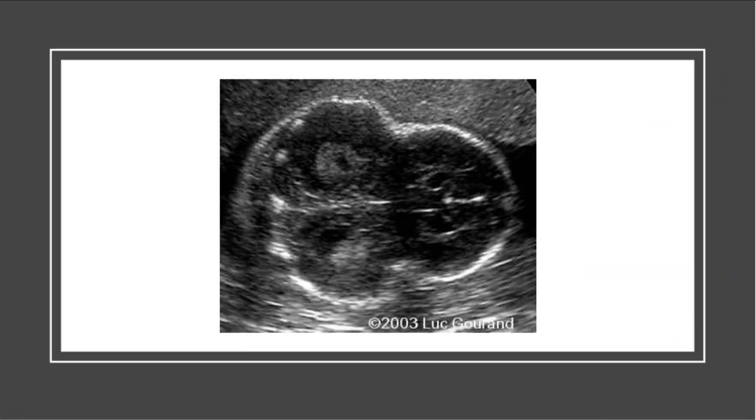So here's a classic appearance of what that cloverleaf skull is going to look like. You can see those cranial bones, especially the parietal bones on the side, forced to close and come in a lot earlier than they should have. So it's giving us this very lobular appearance. Of course, that's going to lead to some problems in terms of cognitive function, because we're now compressing the space that the brain has to develop and function.